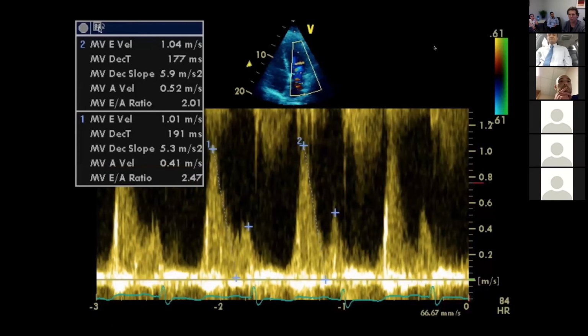And the last thing I was trying to look at with this was that often one of the signs of severe MR can be an E wave greater than 1.2 or 1.3. We didn't really see that with this one, but it's what I was looking for, and just trying to remind people that assessing for MR severity, use every little trick you've got and don't forget about the big E wave, because you've got so much blood coming back into the left atrium, it pushes it forward into the left ventricle and you have a volume overloaded mitral inflow.